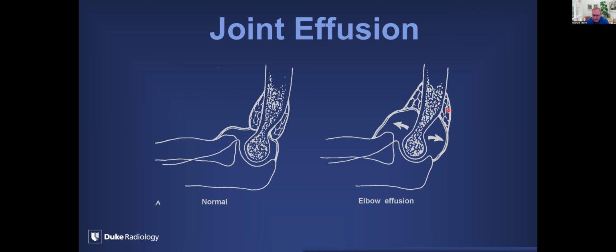radial neck. So what we recommend, knowing that these healing changes occur in a regimented fashion, is we recommend a follow-up radiograph in 10 to 14 days. And why do we do that? Well, that visualization of that periosteal reaction is one of the few things we know for dating fractures, and it typically occurs between 8 and 10 days. Hence the logic behind recommending a follow-up to see, in fact, if we can see those radiographic manifestations of healing, and we typically see it at the radial neck.